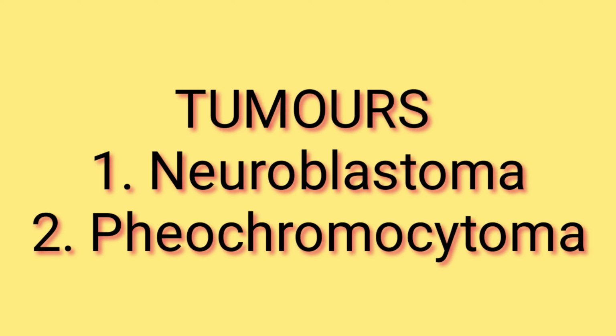There is a wide list of differential diagnoses. In these consecutive slides, I have mentioned the differential diagnosis. Let's start watching the images.